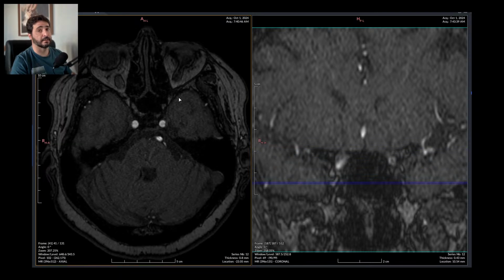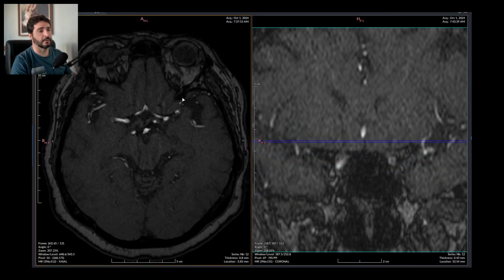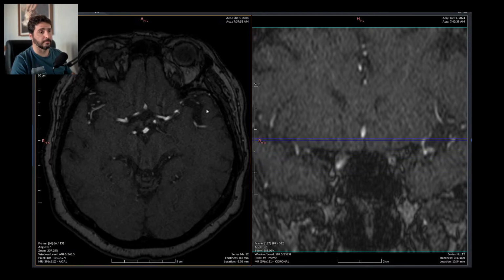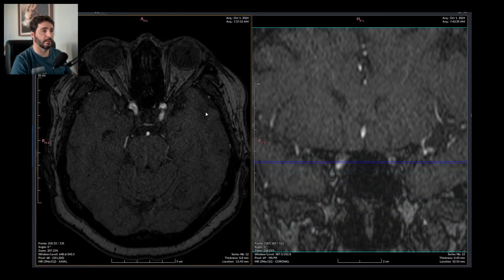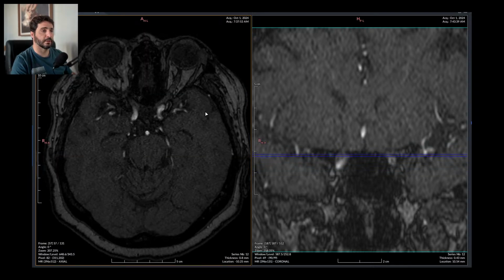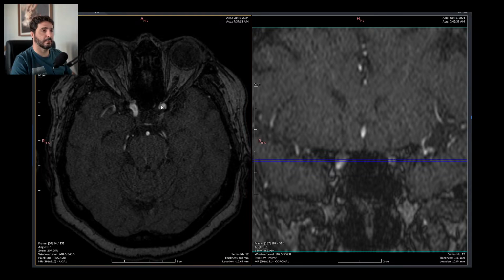So if you guys don't know the segments of the carotid arteries, you gotta know your anatomy. So pause the video and go study vascular anatomy of the brain. It's awesome. Just awesome. The more you study anatomy, the more you are sure you know so little. You should be studying more. So these are the ophthalmic arteries. It is quite common for aneurysms to show up right here.